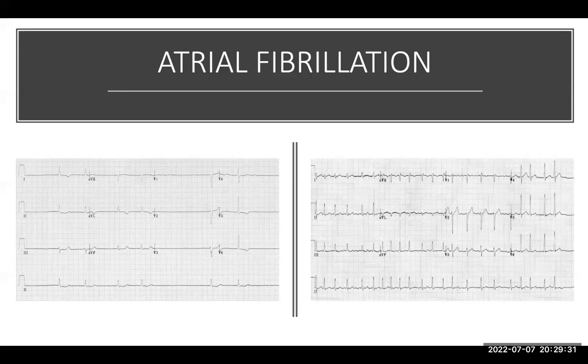The other thing you'll be asked about atrial fibrillation is, what else apart from stroke evaluation? The next thing is rhythm versus rate, because most of these patients, usually their heart rate is very high, but not always. Like this ECG on the left side, we call it atrial fibrillation with slow ventricular rate. This one, atrial fibrillation with fast ventricular rate. As you can see, it's very fast. And this is the rate I was telling you.